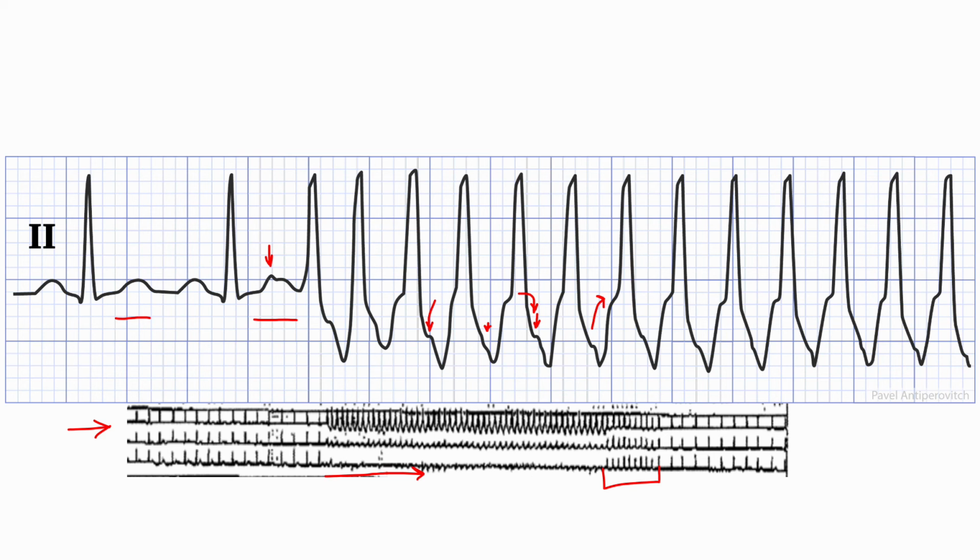Okay, so just probabilistically, what are the chances that there's two tachycardias here? I mean, it's slightly lower. The most likely explanation is the simplest one, which is that this is one tachycardia, the same mechanism, and there's some sort of aberrancy of bundle branch block initially. And then if the rate slows, a little bit of adrenergic drive or something, the conduction down the non-functioning bundle recovers and it narrows suddenly. So this is not a slam dunk on this little rhythm at the bottom, but this certainly would be compatible with an SVT with aberrancy.